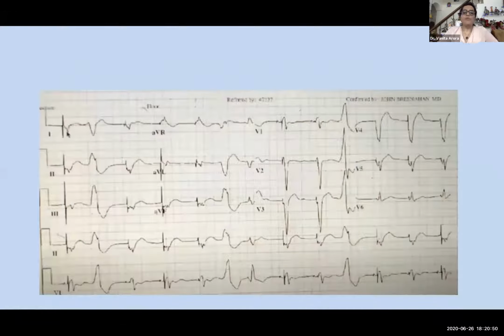You may have a post biventricular pacemaker ECG which is like this. You have given a good result. The lead V1 is biphasic. There is an initial positive complex and then negative. Lead 1 is negative. But look at the ventricular ectopic activity. These are monomorphic VPCs, which are coming in between quite frequently. This will not let the biventricular pacing be at more than 95%, which is what we are aiming at. So it is better to take care of these ectopics, do an RFA, and just get rid of them, or stabilize the medical therapy, which is very important to give a good result in these patients.